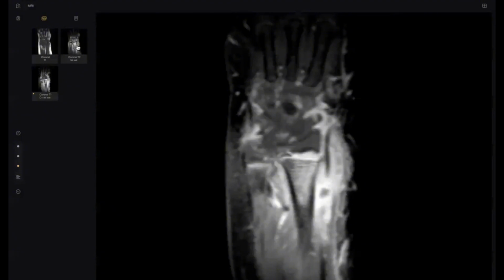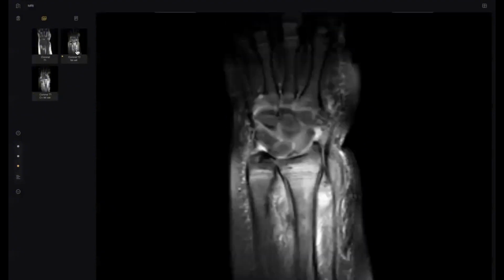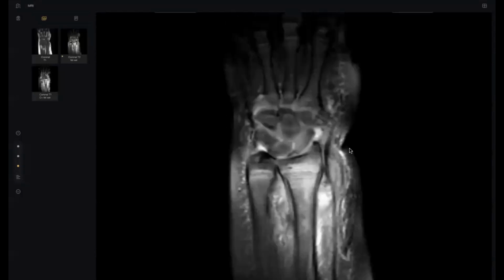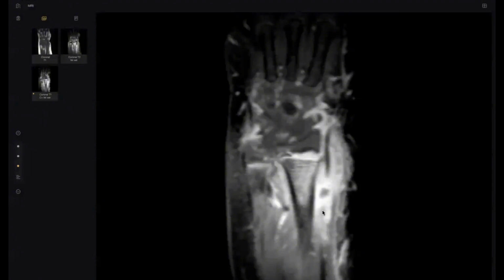In this MRI, I see an increase in signal intensity at the right. Okay, and this is the post contrast. So what's your diagnosis? There's an increase in hyperintensity, and the surrounding tissue also appears hyperintense with enhancement. I would say this is osteomyelitis.